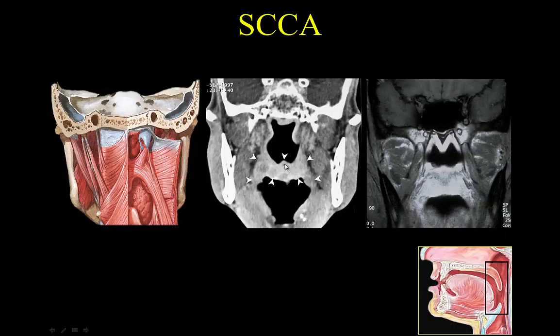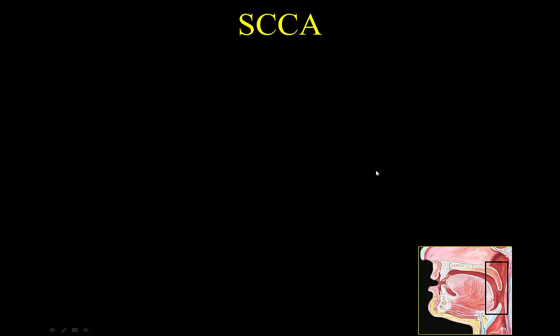Another coronal image, here we see a squamous cell carcinoma on the coronal image involving the soft palate, and here we see it on MR, a contrast-enhanced T1 weighted imaging with fat suppression. So again, the number one tumor, as with anywhere in the visceral space, is squamous cell carcinoma.